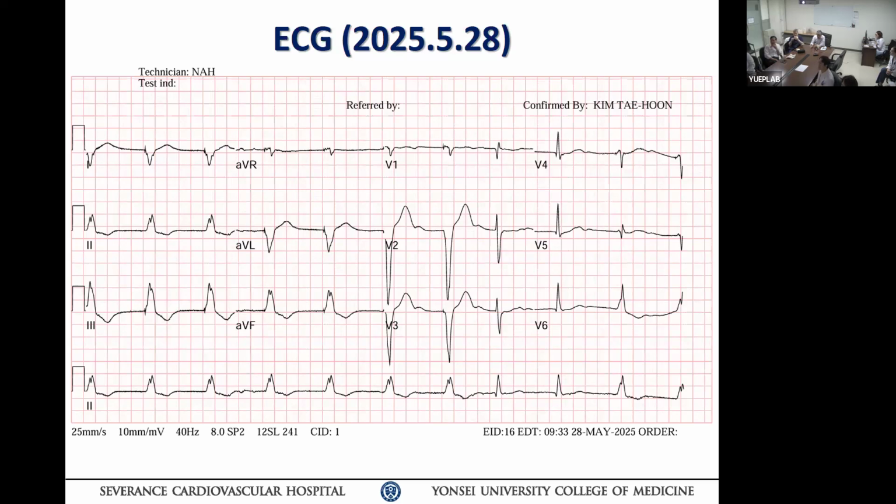I don't know if people look at this carefully or not, but on a 12-lead ECG the pacing spike can tell you where your pacemaker lead actually is. We don't look at that carefully because with modern pacemakers the bipolar lead spike is very small, so it is seldom seen. However, if you increase the output, you can see a higher spike. So it is coming from somewhere inferior and leftward, this way. So it has to be the right ventricle, right? It could be the left ventricle; if it were, that would be isoelectric or negative. So when you interpret the pacemaker, you have to look at everything.